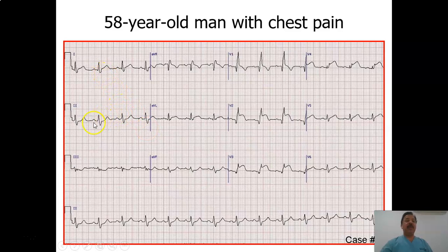Any hypertrophy? First atrial hypertrophy: P wave in lead II. There seems to be no atrial hypertrophy. Look at the ventricular hypertrophy. If the QRS complexes are wide, it's better not to comment on ventricular hypertrophy. Like here in this example, these are wide QRS complexes. Look, any bundle branch block? Yes. If you look at lead V1, there is a tall, wide R wave, and a wide R wave and deep S wave in V6. So there is right bundle branch block.